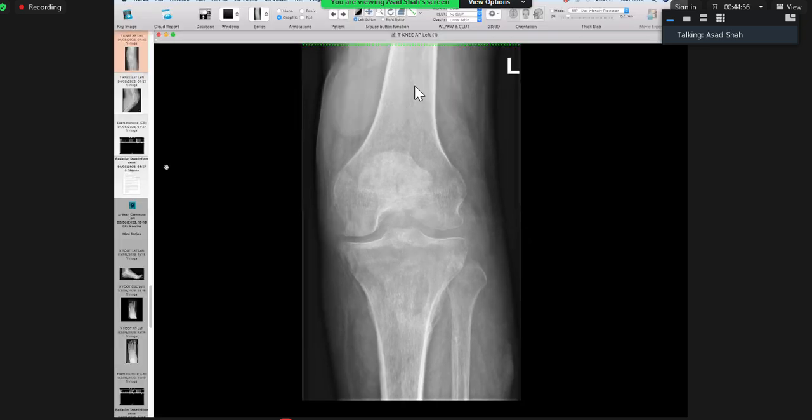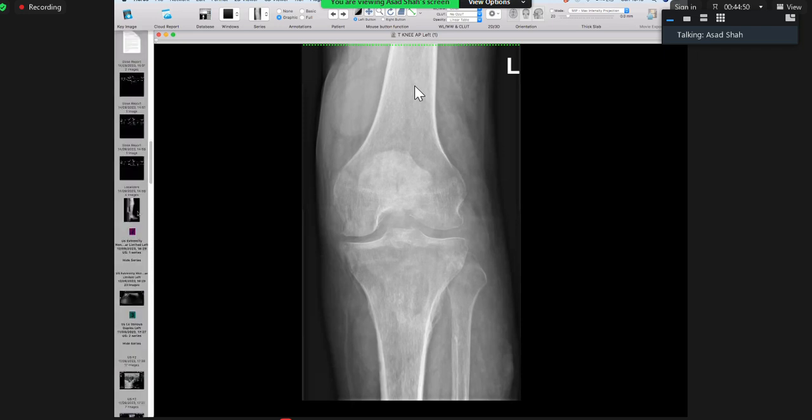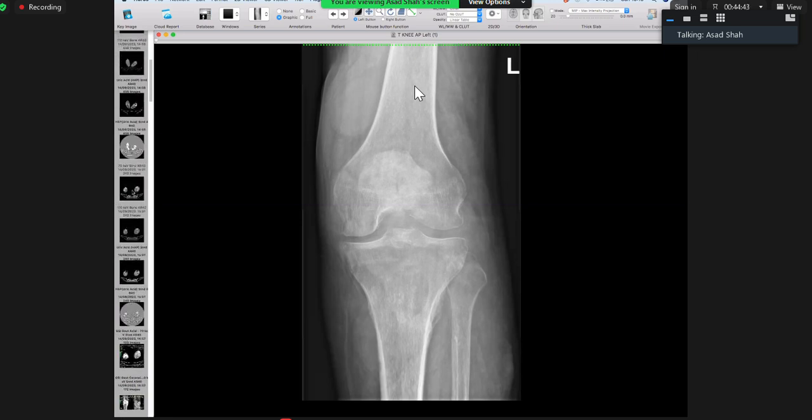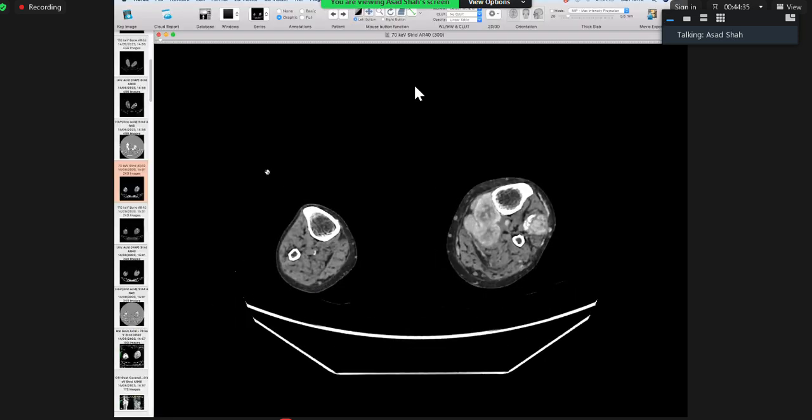Okay. I'm going to show you the CT now, actually. We did a CT because the patient was claustrophobic and we couldn't do the MRI. Okay. Wait, let me get you a CT right over here. Yeah, all right, okay. So we can scroll.